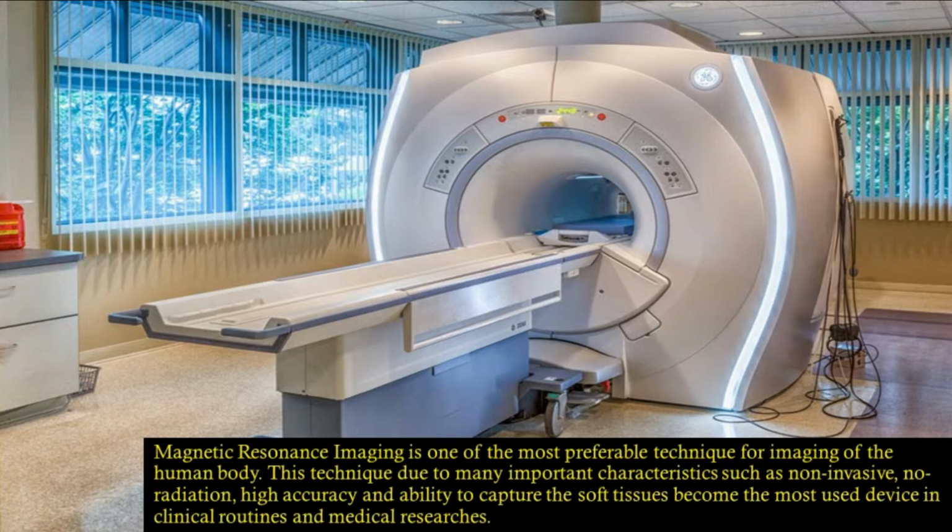This technique, due to many important characteristics such as non-invasive feature, no radiation, high accuracy, and ability to capture the soft tissues, has become the most used device in clinical routines and also medical research. This technique can provide many detailed images of the brain, spinal cord, and vascular anatomy. In addition, the ability to capture the organ image in three different perspectives, axial, sagittal, and coronal, has made this technique unique among other techniques such as X-ray and CT images.